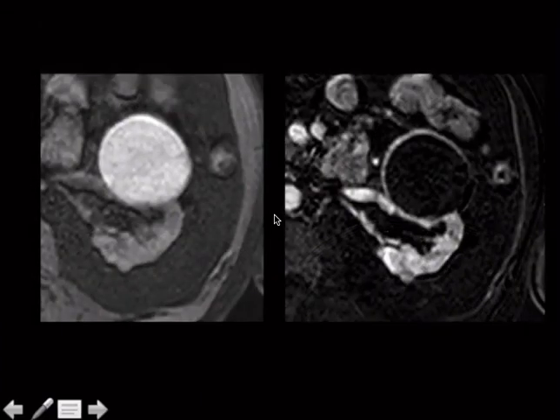So here's a zoom up. So this was our pre-contrast T1 image here, and this is our post-contrast T1 image here, and this is our subtraction. So we can't tell whether or not it's enhancing truly here. We look on the subtraction, we see that there's not any internal enhancement. Somebody could make an argument that this is a little bit of rim enhancement. I think it's just stretched renal parenchyma, and I would let that go.